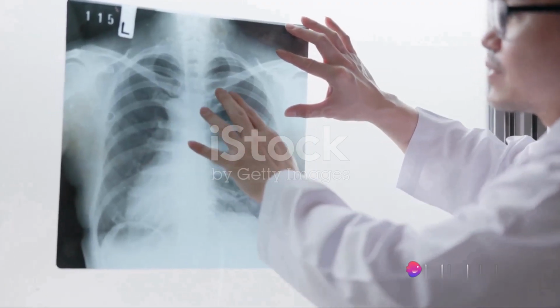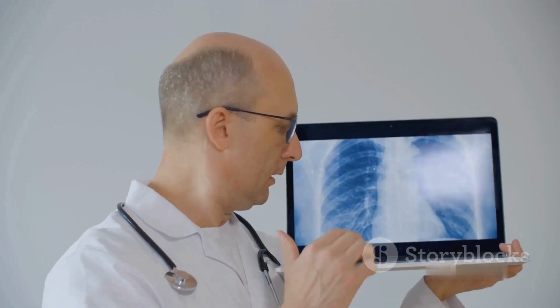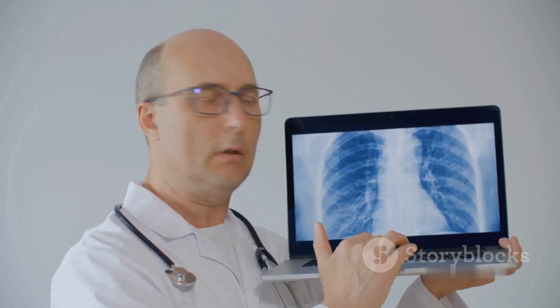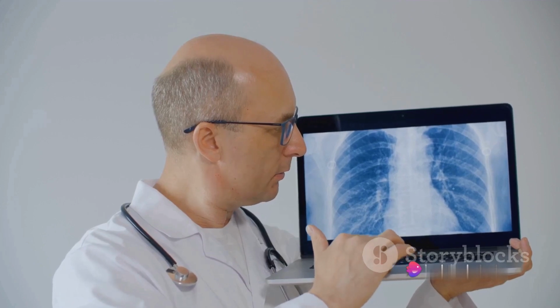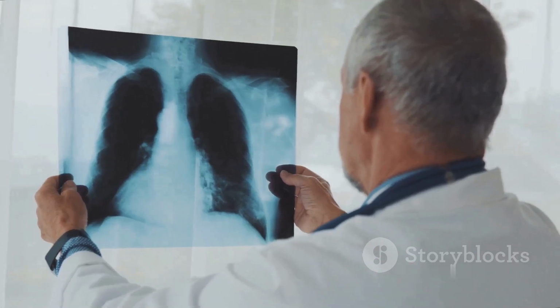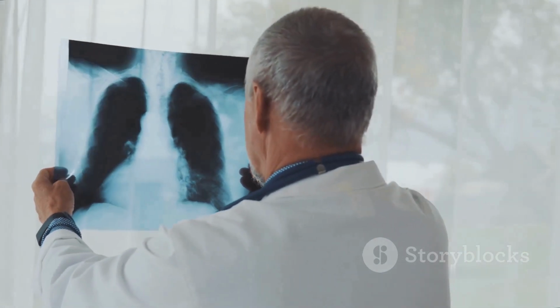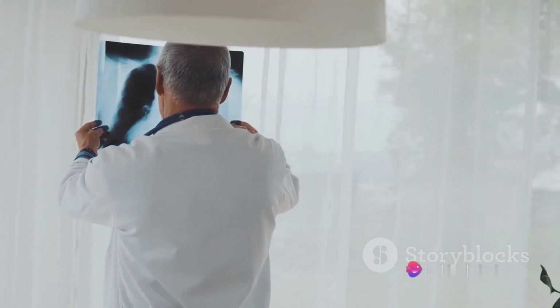Now here's a key point to remember when interpreting a chest X-ray. Always assume that the patient is facing you. Why is this important? Because it helps you correctly identify the right and left sides of the patient's chest. Your left corresponds to the right side of the chest X-ray, and your right corresponds to the left side of the chest X-ray. This might seem a bit confusing at first, but it becomes second nature with practice.